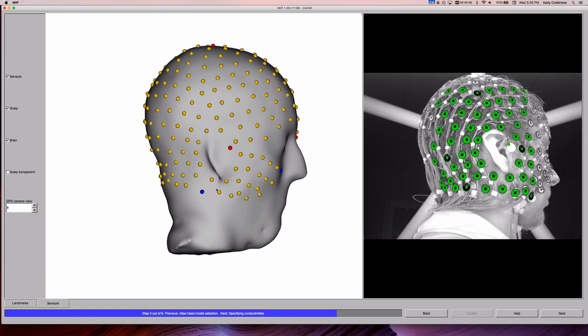You can use different groupings of sensors in triangles to help you evaluate if movements need to be made. For example, you could create a triangle among these three sensors here and see if the orientation and direction of that triangle matches that of the patient in the right. This one does.